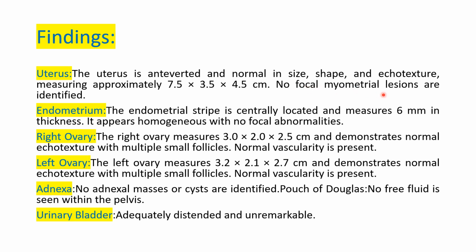No focal myometrial lesions are identified. Endometrium: the endometrial stripe is centrally located and measures 6 millimeters in thickness. It appears homogeneous with no focal abnormalities.